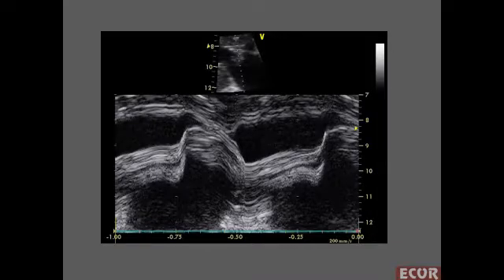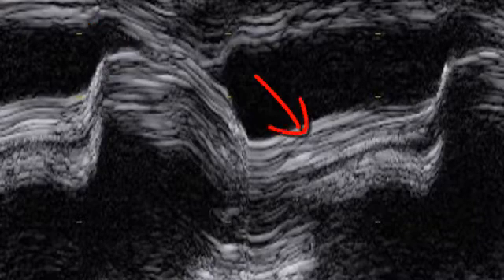One more case of heavily calcified mitral stenosis. But look here, there is also vegetation in this valve. In this location, you see obvious aspect of calcification with clear-cut lines. But in the same valve, there are smudge and ragged torn paper signs of vegetations.